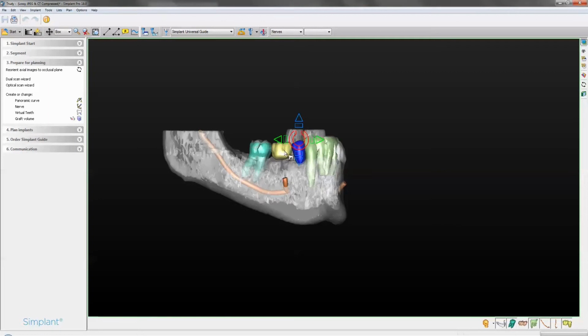So I think my molar is ever so slightly big. We can just shrink that by holding that little rectangle. That makes it small. The arrows allow you to move it bodily. And the rotational icons are these ones here. So you can actually rotate the neck and correct it if needed. You need to spend a bit of time to do this, not too much.